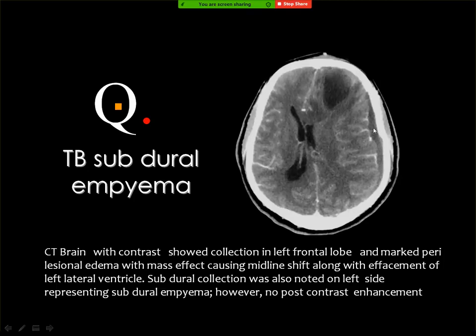No, I'm talking about this collection, but this is ischemic brain. This one? Okay.